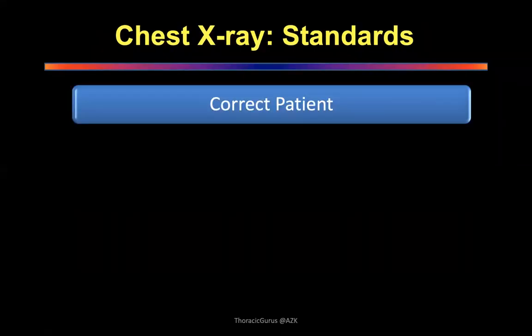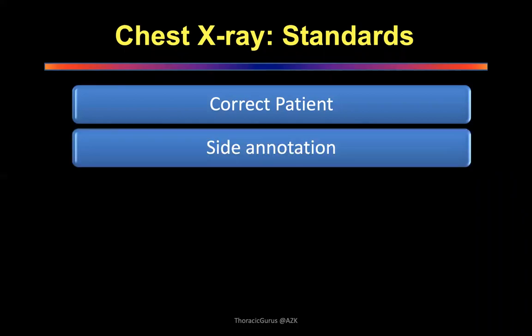All right. Whenever you're looking at a chest X-ray, please, for God's sake, make sure it's the correct patient. It is the most important. The identifier is very, very important. And the identifier usually is either the name of the patient, the hospital number, or the age of the patient. These are the three identifiers which are supposed to be mandatory on any film, whether it's CT or chest X-ray. Do not start interpreting any radiology without identifying that it belongs to this patient.